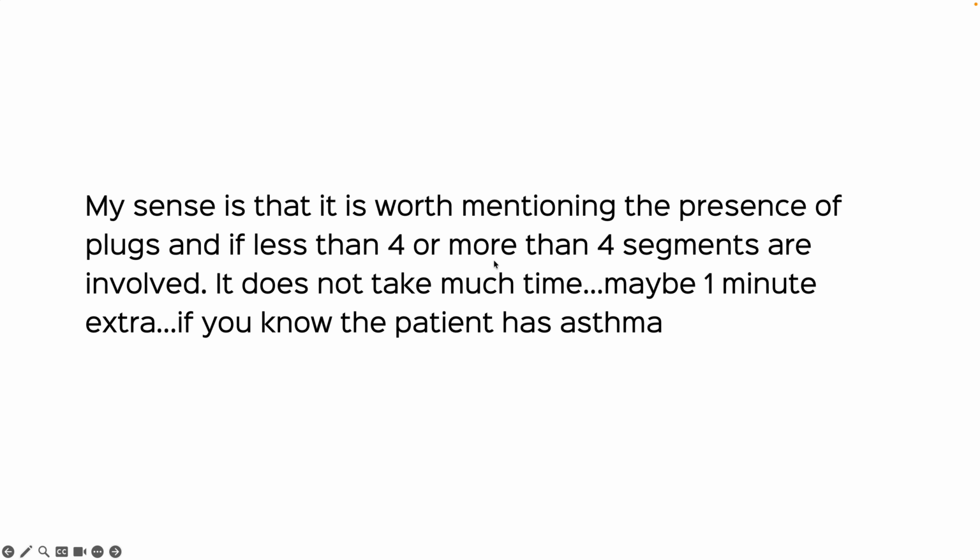There's no harm mentioning very quickly that there is mucoid impaction, that there are more than 3 or 4 segments involved or less, and then leaving it at that, and let the chest physician decide what to make of that information. We've been doing that for some time without realizing this, because we've been identifying mucus plugs, but I've never looked at any of this data, so I wasn't aware. But I think it's worth the effort.